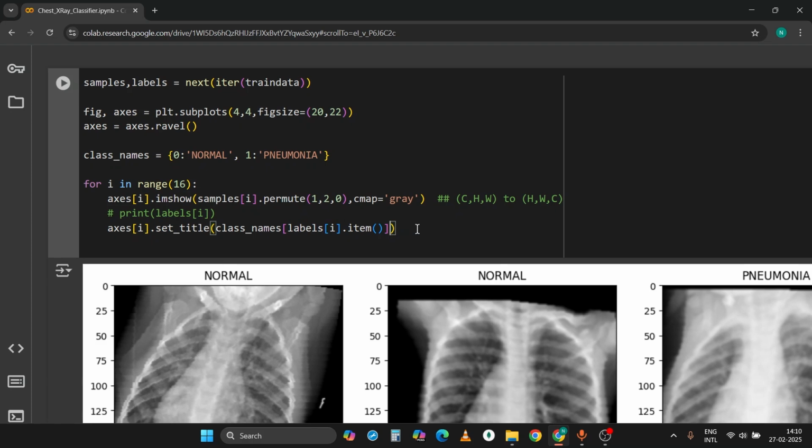Let me show you one more thing. Let me set the title. Let me print it.